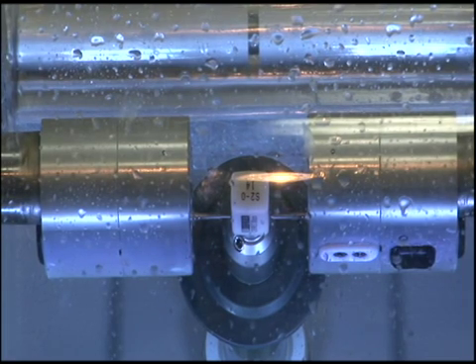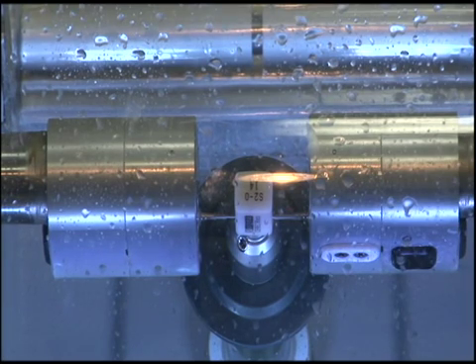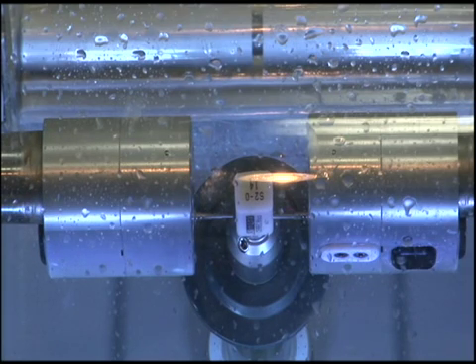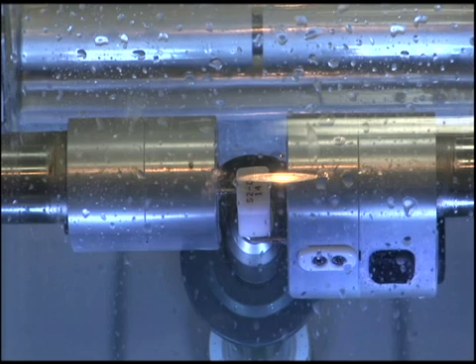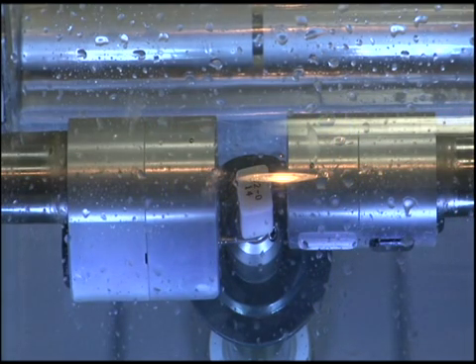So here it's going through its measuring and calibration process to make sure that everything is in the right place and the right size. And then it's telling us that to make that extremely strong crown, it's going to take 14 minutes and 22 seconds compared to 3 weeks. That's pretty impressive, I believe. And we'll get to watch it start. As the water spray to keep it from overheating starts, it'll interrupt our view here, but we'll get to see the beginning.